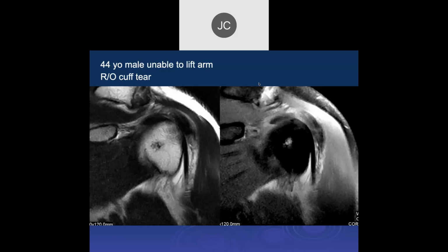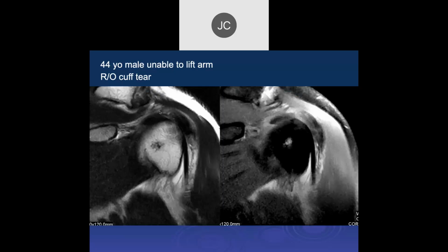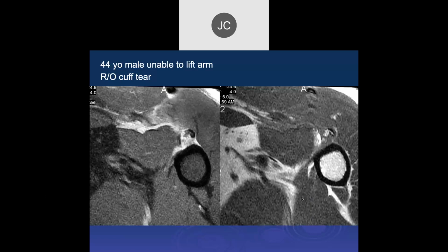What's jumping out at me is, is there some signal in the deltoid? Or no, I think that's just part of maximal retraction, a section of signal through here. Actually, if we went from, see, it probably does have a supraspinatus tendon tear. Maybe that could cause it to not be able to do that. Okay. There's also a lot of edema down in this area. So if we look down here, they have some.